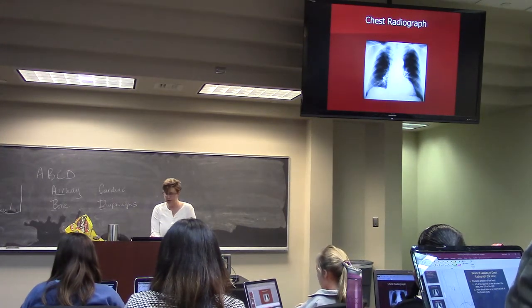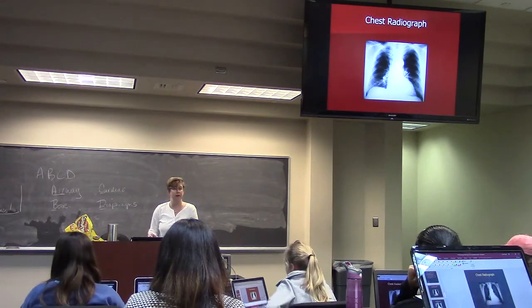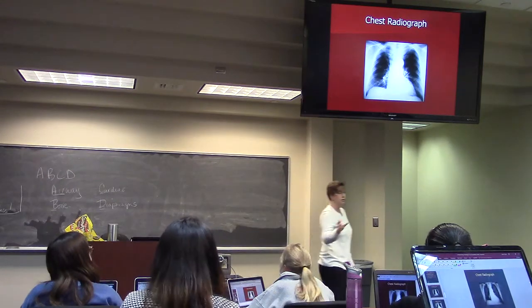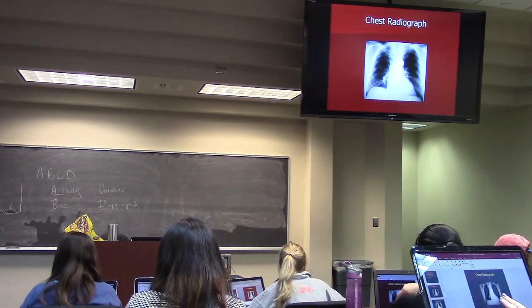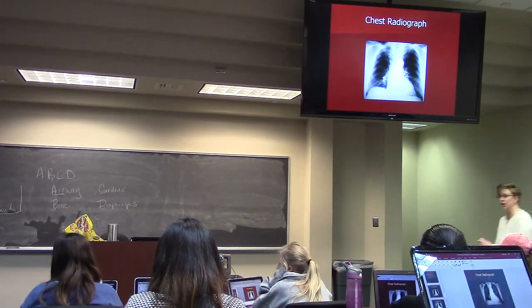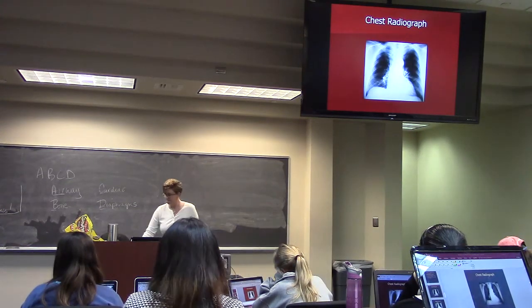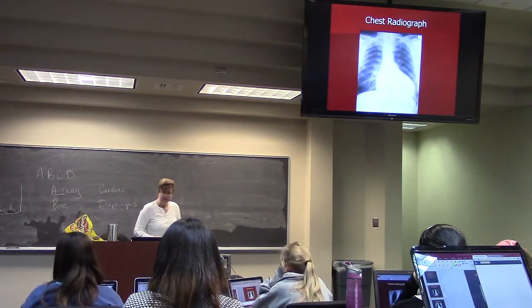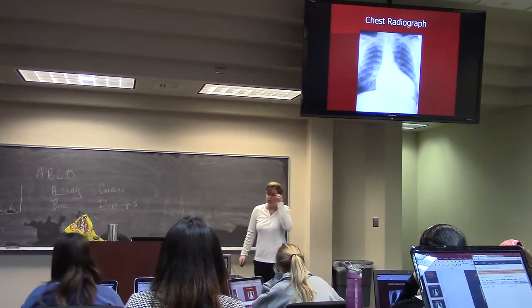So if you measure this, it's greater than half. Okay? So take your computer screen and measure it. Just do it. Do what I say, not what I do. So you'll see that it's actually greater than half. It's greater than half, that's easy. That's cardiomegaly.